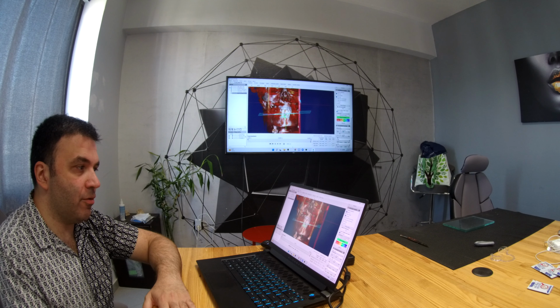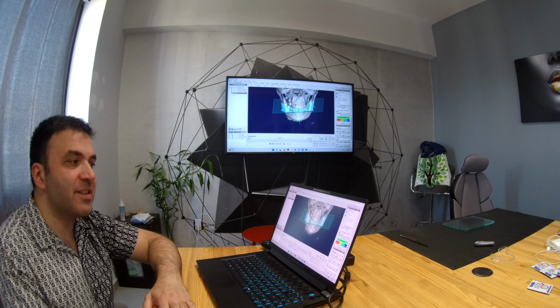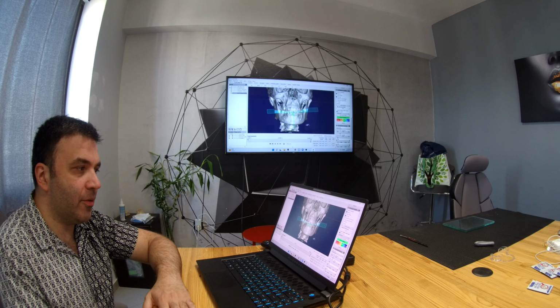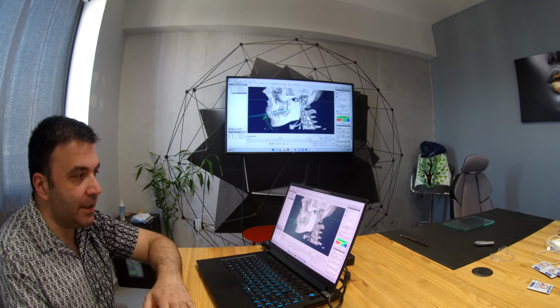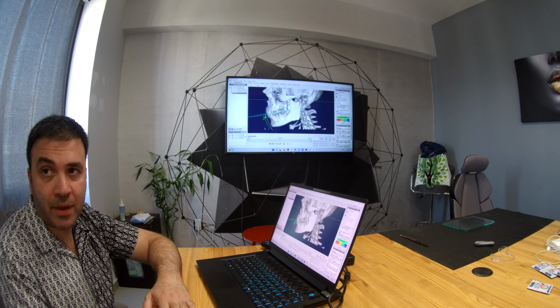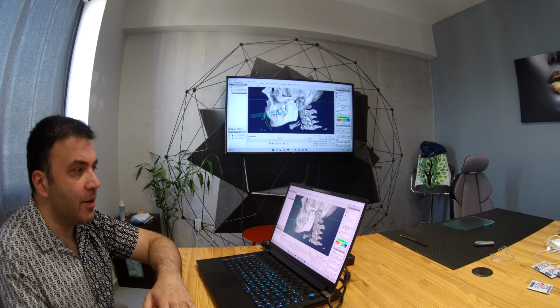So it is called jaw segmentation. For that, is this the occlusal plane? It's the prosthetic plane. It's made by the program. Sorry, can you explain it? What do you mean, prosthetic plane? The prosthetic plane is, I guess, what we call the idealized occlusal plane. So if you use this plane, it will be okay, Panayotis.